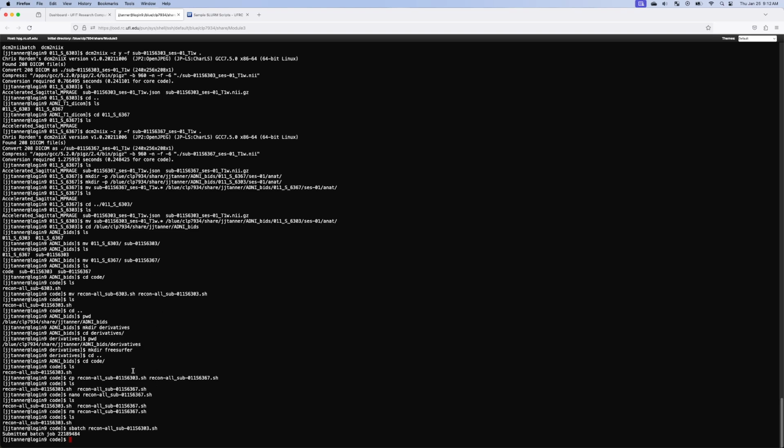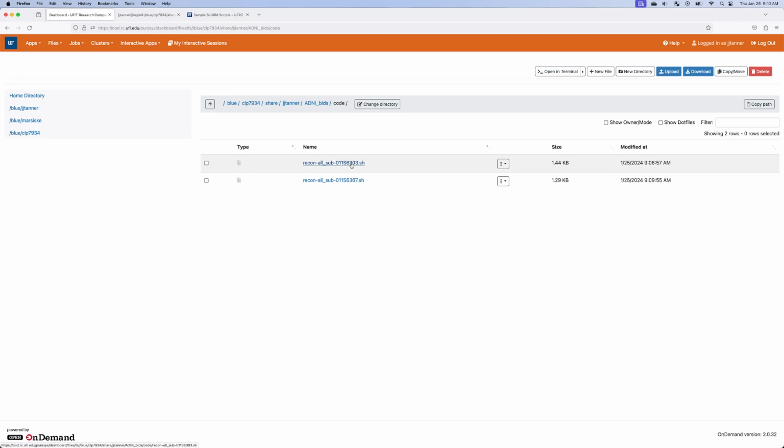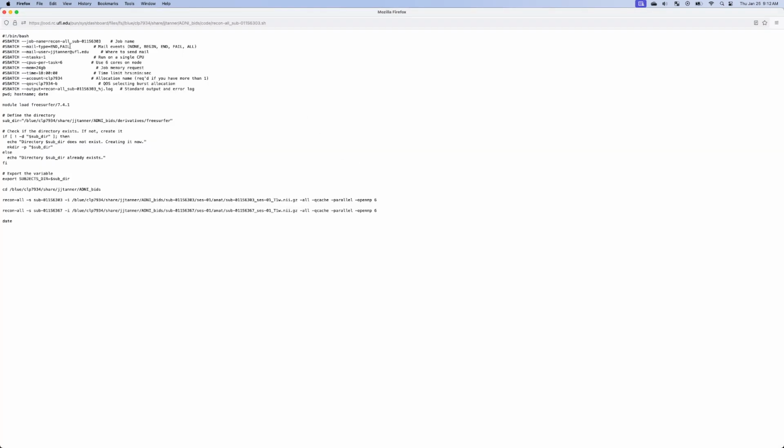Now, how do you know if it starts? How do you know if there's an error? You should get an email if there's an end or a fail, which we put in the script. Again, if we look at this, end or fail. So if it fails for some reason, you should get an email. That could be one way to check.